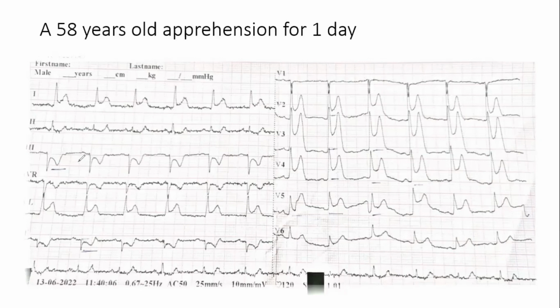But here you can see the inferior leads. So these are ST depressions over here in 2, 3, and AVF. So the pericarditis will not give this picture. So don't confuse the type of elevation with whether the MI is present or not. So still these types of elevations, although they are not very typical, but definitely when you elaborate this and you see the patient as well, but that is for the clinical practice.